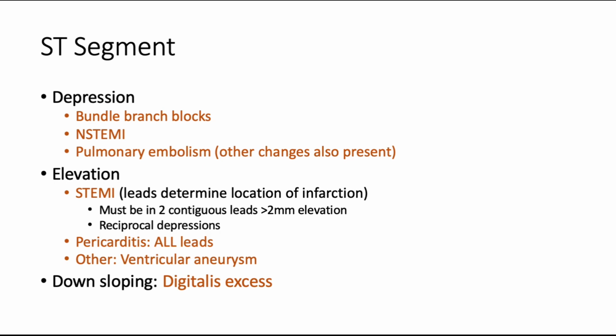And the location of those ST segment elevations is going to help us determine and pinpoint the location of the infarct in terms of which artery is actually blocked. Additionally, you should see reciprocal depressions. Sometimes my eyes have an issue where I go straight to the ST segment depressions and I get tripped up in those, but don't actually look for ST segment elevations. And it turns out that those are just the reciprocal changes.